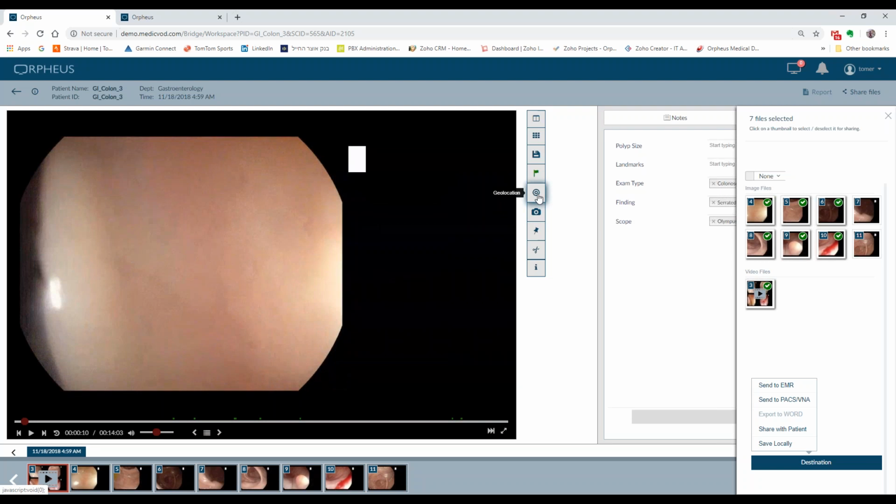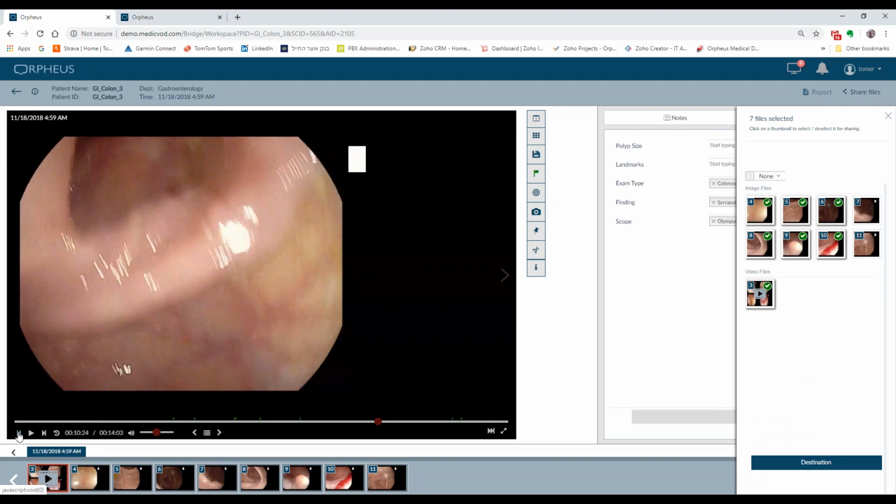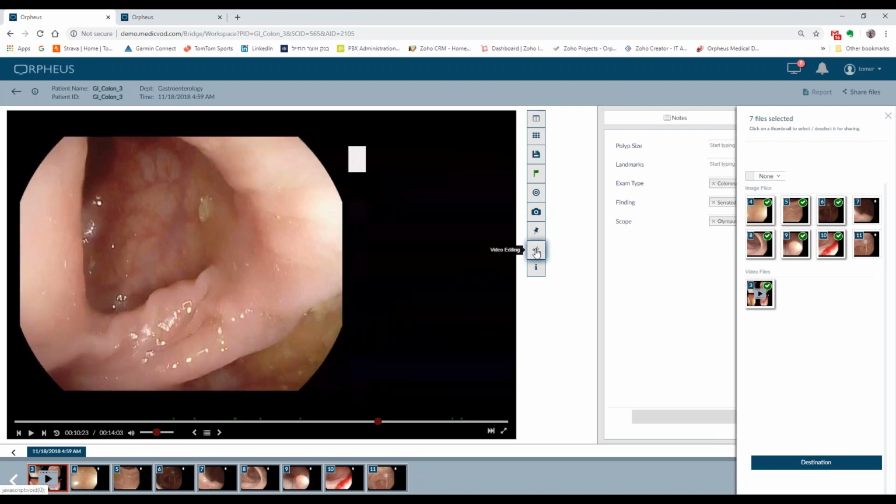Geolocation is the next little feature that perhaps will be disabled in the case that we're talking about. It's more for if you took images with your mobile app device. You can take a snapshot. This is exactly what it is. If you want to create more content, you can see here I scroll frame by frame across the video, and when I'm satisfied, I can take a snapshot or add a bookmark, which is like an index on the video itself.